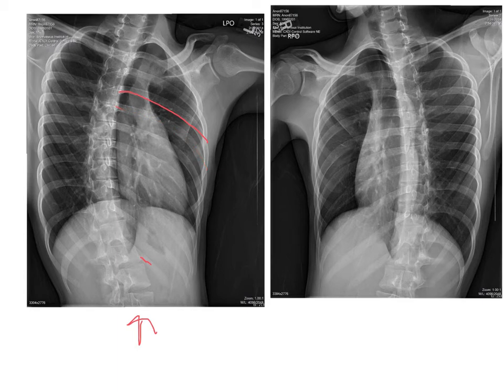Another thing that you can look at is the location of the sternum. Here we can see the tip of the manubrium, so we're going to assume that our sternum is laying right about this area. We don't see it very well, and that's perfectly acceptable for an oblique rib projection, but you can guesstimate where it might be. The xiphoid tip is going to be right here in between the vertebrae and the lateral rib margin, which is a good indication of correct obliquity.